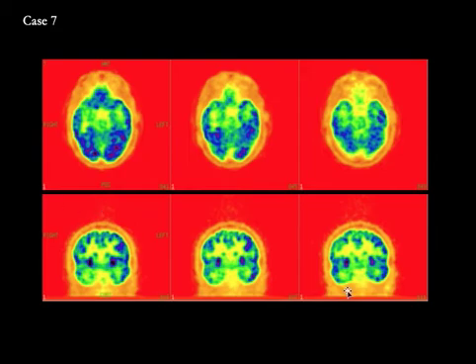So here the finding is seen in the right temporal lobe, which is hypometabolic compared to the left temporal lobe. So this would be the likely source of the seizure focus. This finding is correlated with an ictal SPECT study.